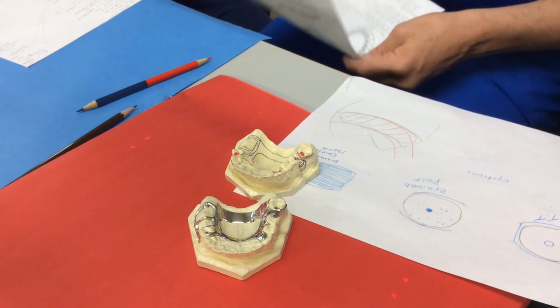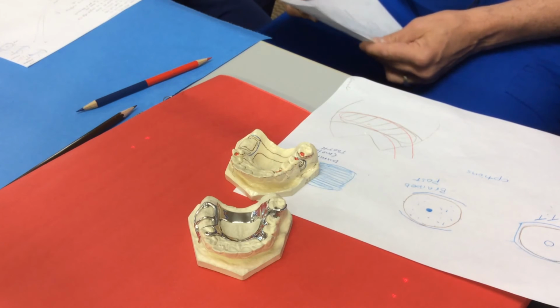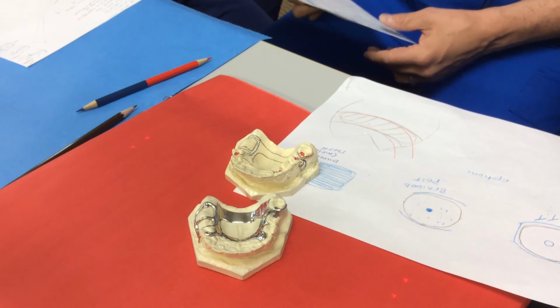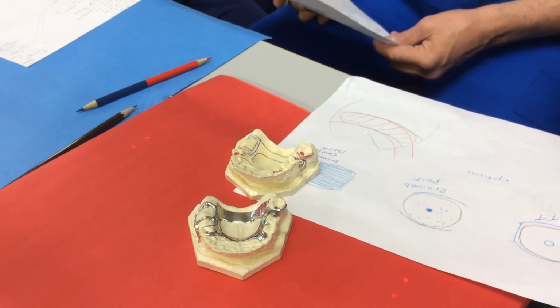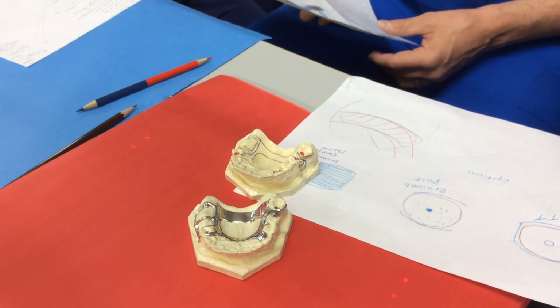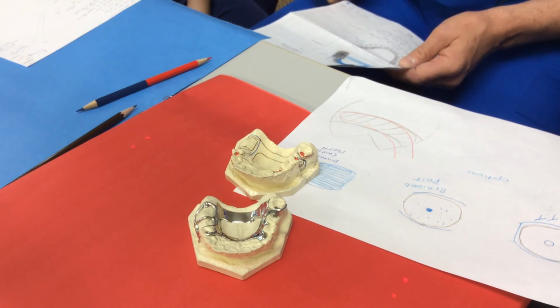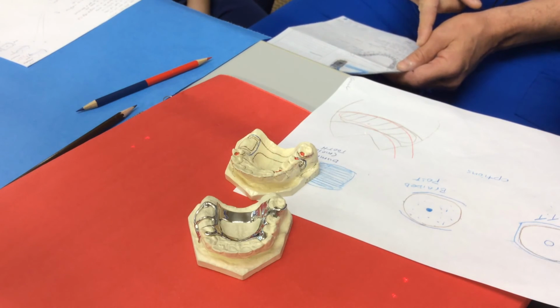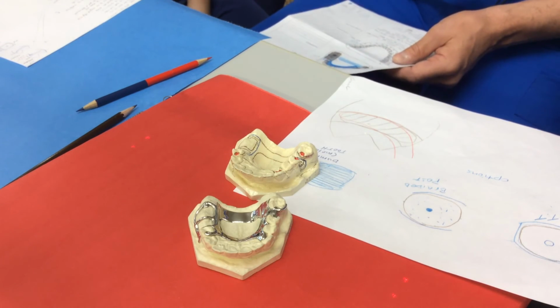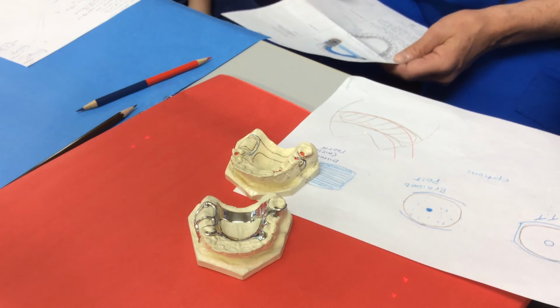Okay, so if you're talking about that lingual plate on tooth number 2, you would simply say under major connector that you're going to have an AP palatal strap, and then that lingual plate on number 2 serves as reciprocation. Since we don't ask you to specifically identify where you're putting reciprocation, it would just be indicated through your drawing. There's no place that you actually have to write it because it's not retention. It's above the height of contour, so you can't put it under retention.